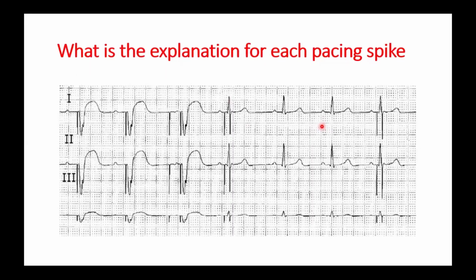Please go back. Okay. So the problem here is the P wave was not sensed. How can you solve this problem? We can make it more sensitive. Yes. So we can program it to a higher sensitivity by reducing the value of the sensitivity. First, measure how much the P wave is sensed by the device in order to go lower and lower.